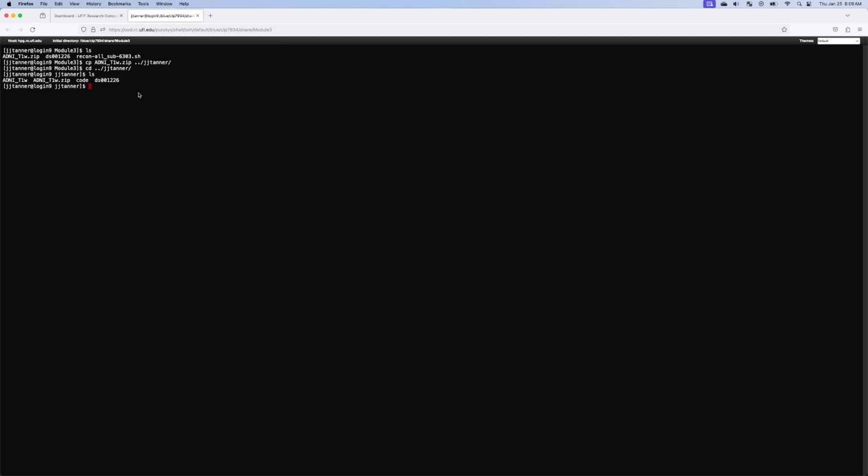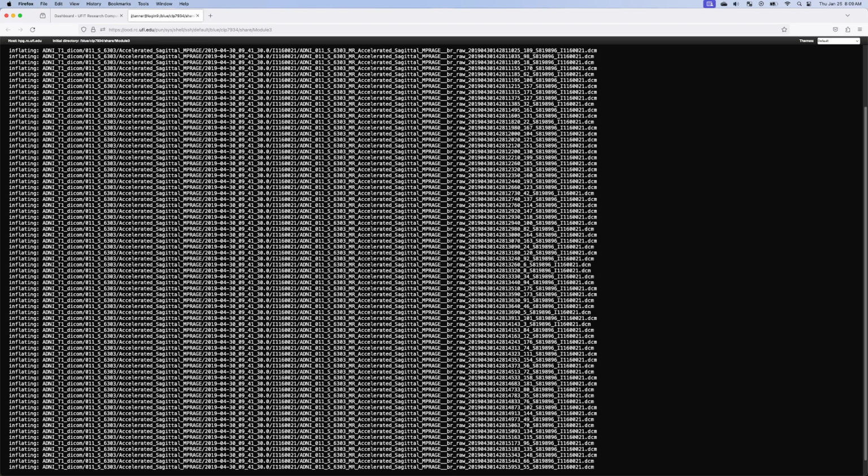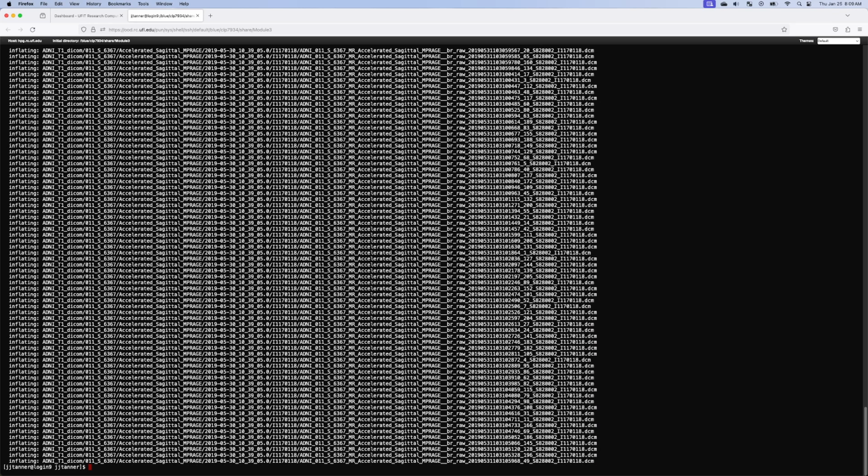So to unzip the file, we can just type unzip. So again, only do this within your current directory. And so I'm going to unzip the directory, and a lot of things will be printed to the screen. Let me know if you have any errors. That would be a permissions issue, and there is a way to potentially fix that. You can change the ownership of the file, everything, but hopefully it's not going to cause any problems.